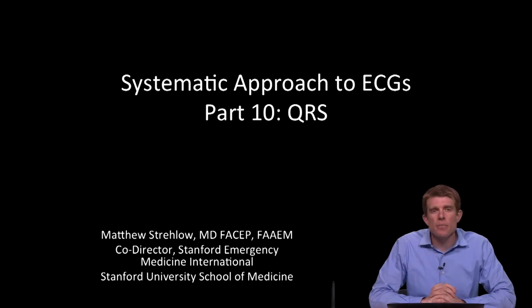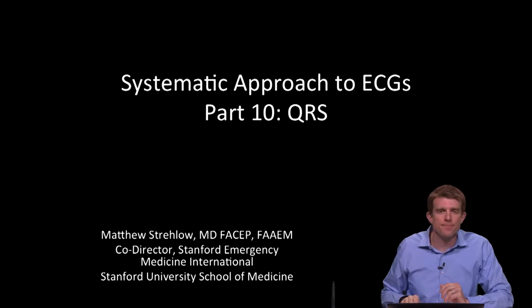Hello, this is part 10 of our systematic approach to ECGs. And in this part, we're going to look at the QRS complex.